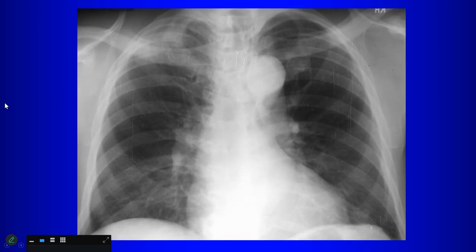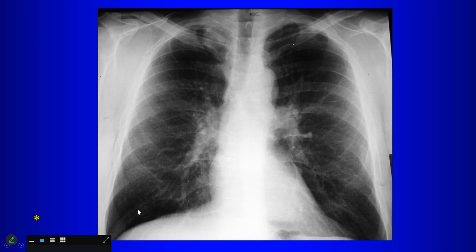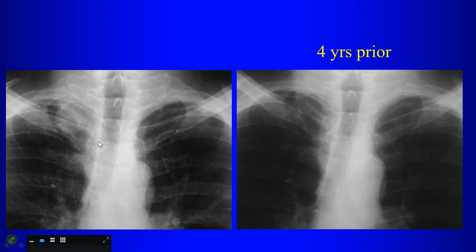So now that we know the game, when you're looking at this chest radiograph, what do we see? Yeah, so there's an obvious mass here, right, in the right apex. So that's a cancer. What about this one? Again, in the right apex, when you look for symmetry, comparing this side to that side, right? And then what helps is when you pull out the prior chest radiographs.